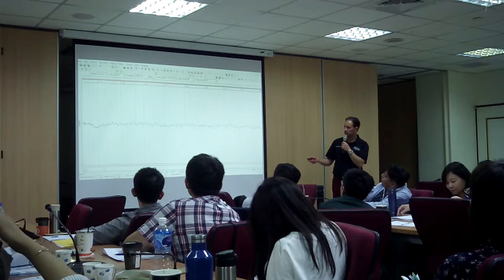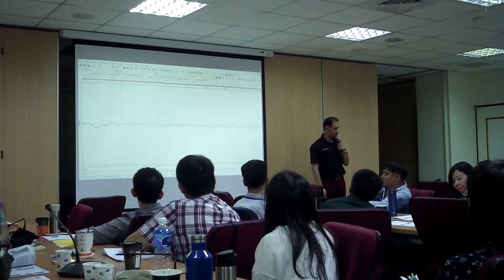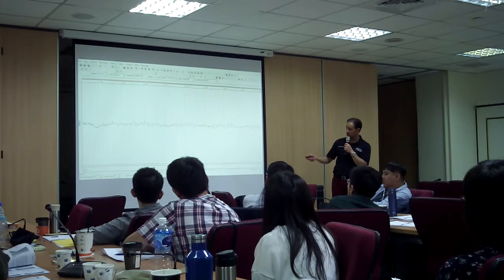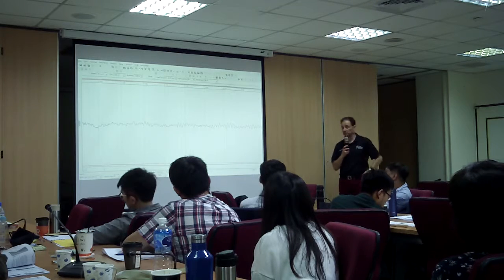Again. 1, 2, 3, 4, 5, 6, 7. 7. So we got slow theta at PZ. So we got the epileptic discharge, but we have slow theta, which is probably related to that. So what does that slow theta at PZ mean for this young fellow?